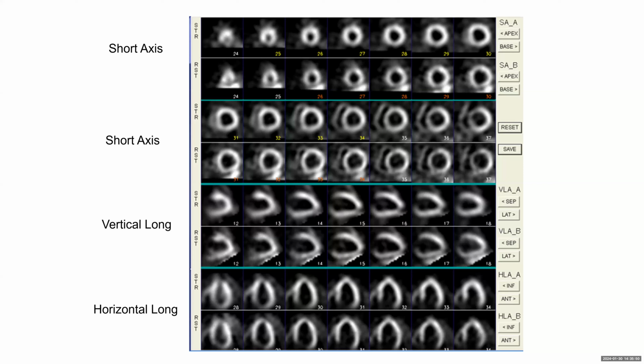I would say dilated cardiomyopathy. It could be balanced ischemia if it's done with SPECT, or need a PET scan or coronary angiography. And if there is an RV uptake, this is a high risk scan.